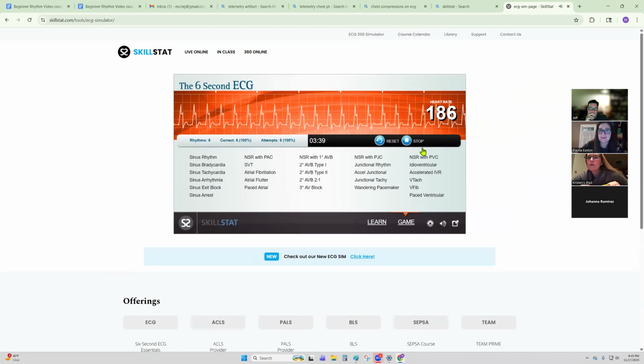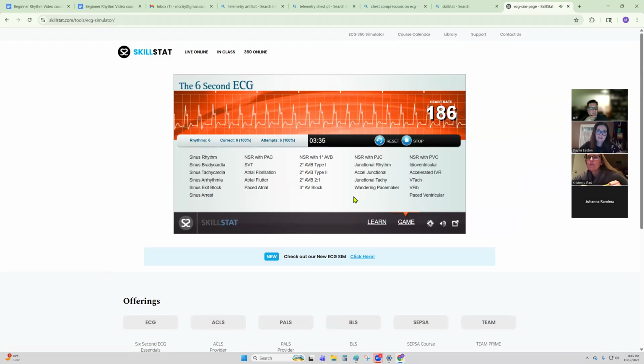Thank you. So again, fast, wide rhythm. I would probably call this a VTach. If I can find it. No panic. Oh, wait, the wrong one.